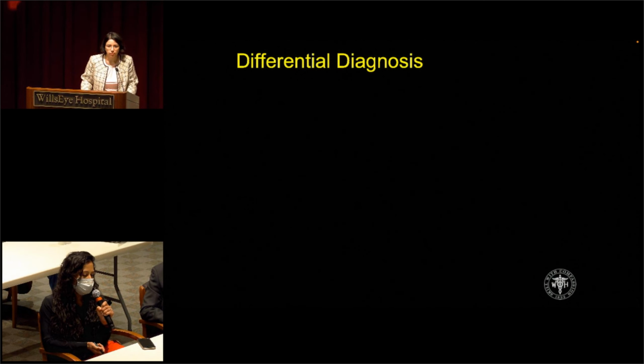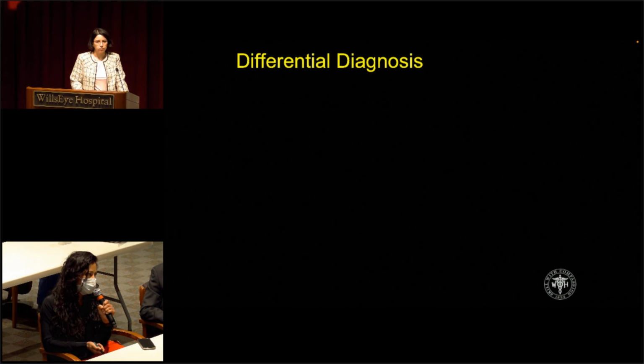It would be atypical for some type of choroidal hemangioma. Metastatic disease is always important to consider, so get a good history of any prior malignancies. This is not a typical appearance for a vasoproliferative tumor. We'd expect to see vascular abnormalities localized to the retina. This is all subretinal and choroidal.